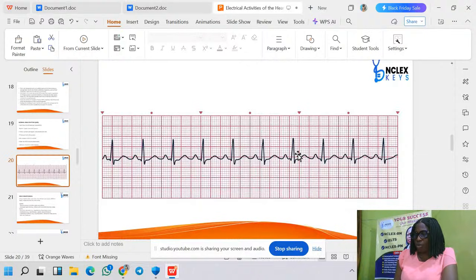But don't worry, I will wait for you. Okay. So what is the pulse of this patient? I need more responses. Okay, thank you. Who else is responding now so that we can move faster?